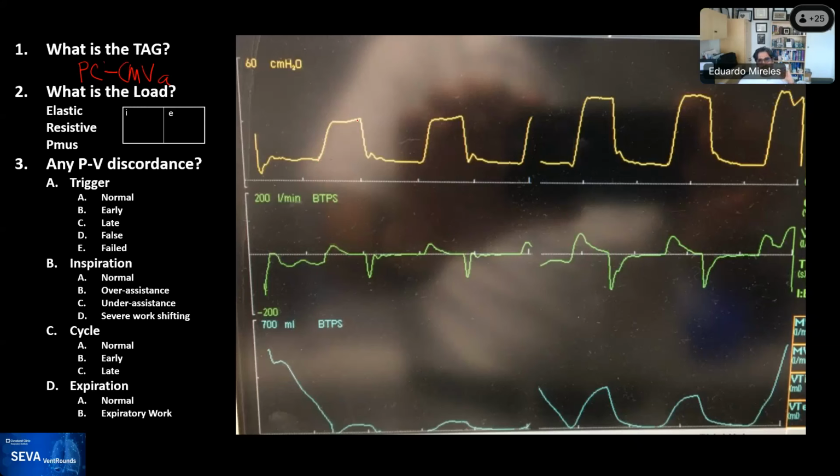You see the device pressurizes, the pressure goes up and then reaches baseline really fast. And then there's absolutely no delivery of flow. Then the patient exhales and it returns to baseline really rapidly. Here there's a point I always try to make: be aware of things. I like to look at the scales. And in this case, the scale is huge.